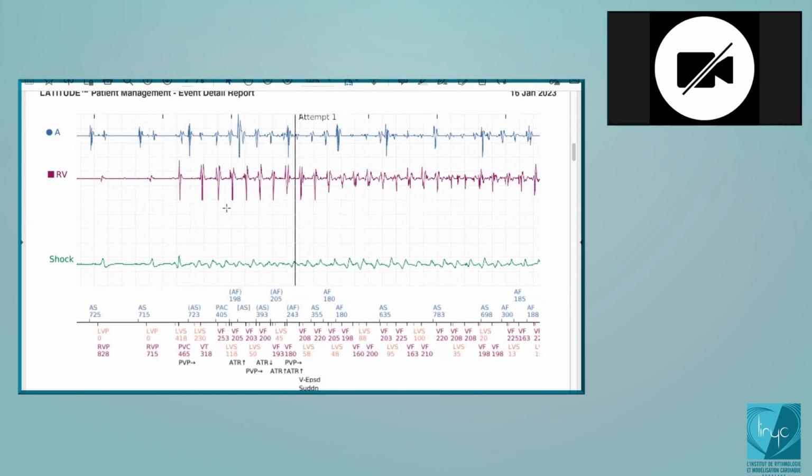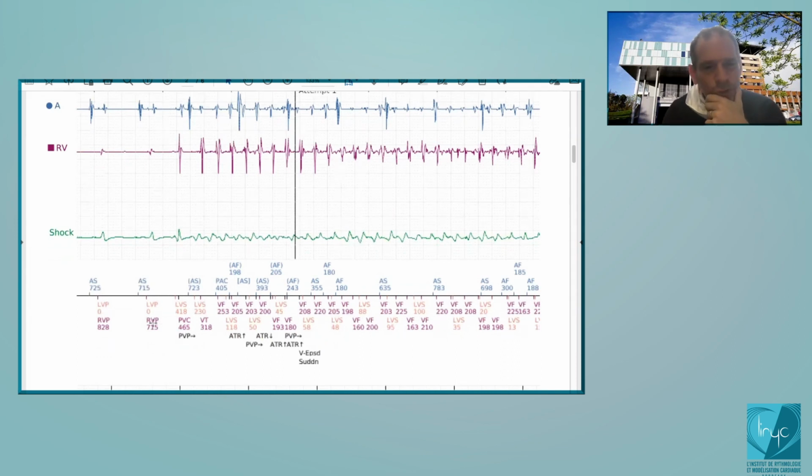So I think there are fast cycles, ventricular fast cycles in the VF zone. Yep. So you need to focus, to interpret how the device will work and how it will detect and classify, only on the purple cycles.